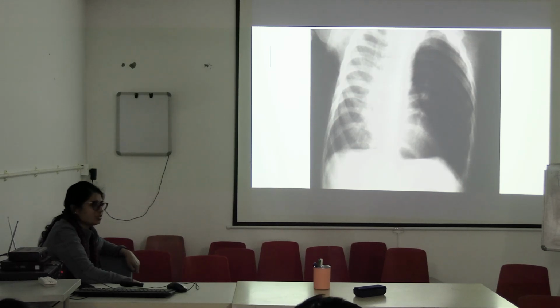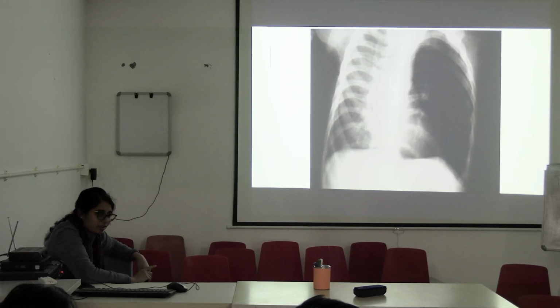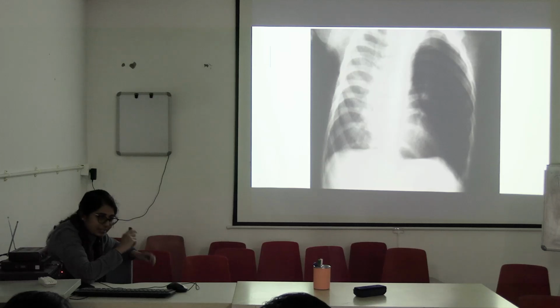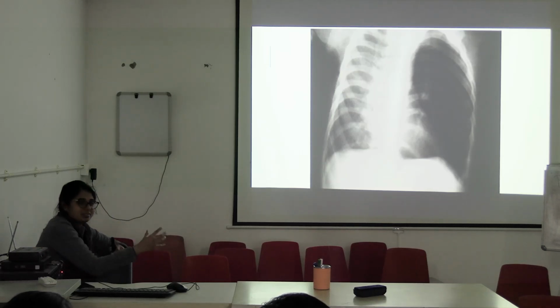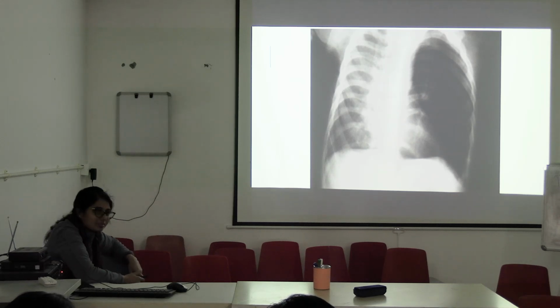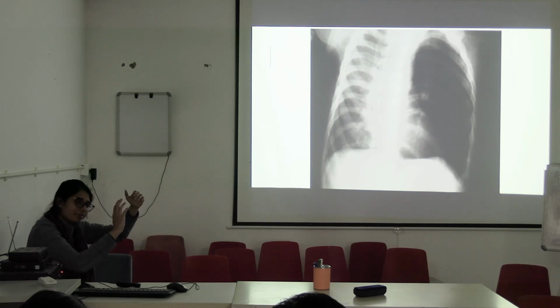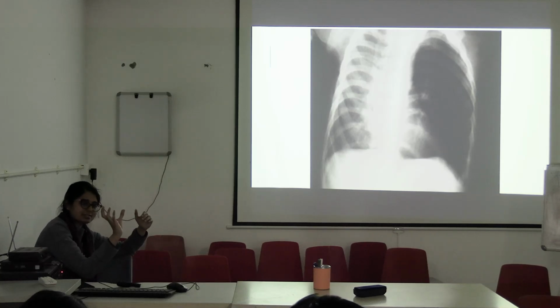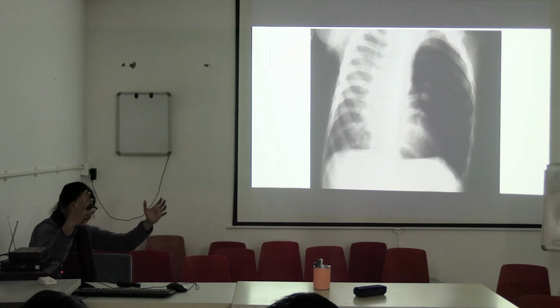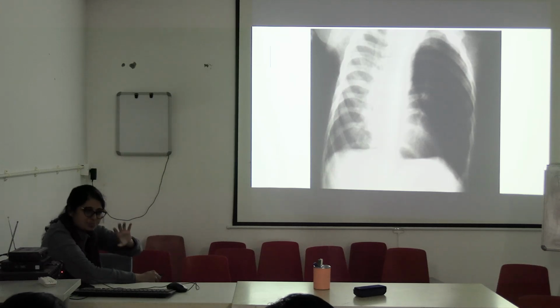Okay, there is a huge hypertranslucency. হ্যাঁ এই ফিল্মটা একটু এরর আছে, এমনিতেও পজিশনটা ঠিক নেই, রোটেটেড হয়ে গেছে, প্লাস অতটা বড় যে হাইপার ইনফ্লেশন অন দ্য লেফট সাইড, it has also pushed the heart, পুরো এমনি করে রোটেট করে গেছে। হয়তো এতটা মনে হতো না, ঠিক আছে, না মানে কি বলতো সেন্ট্রাল নেই, একটু বেঁকে গেছে, রোটেট করে মানে একটু ঘুরেও যায়। কার্ডিয়াক শ্যাডোটা ভাব না, cardiac shadow is like this, it can become this, এরকম পেছনে চলে যায়, because the lung is pushing or the lung is pulling. Okay, there is a torsion force over the heart, it is pulling, it is pushing.